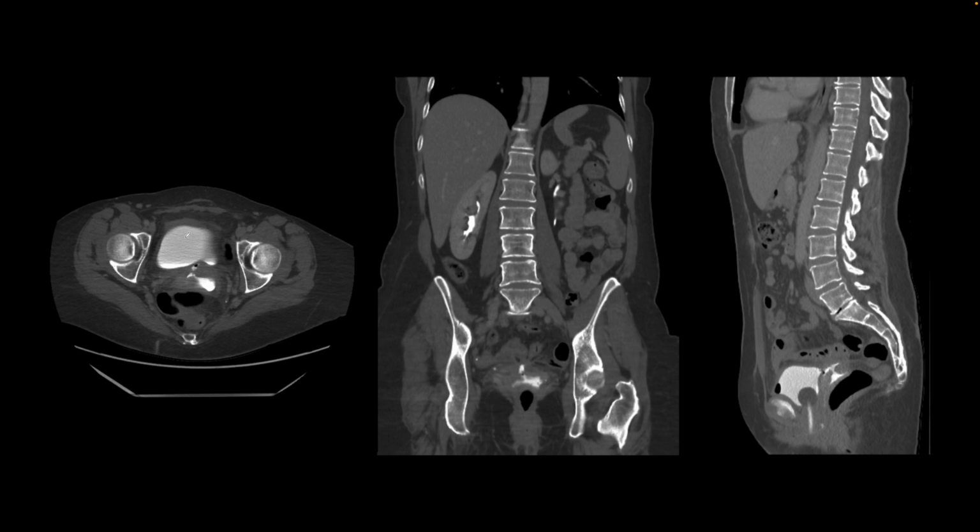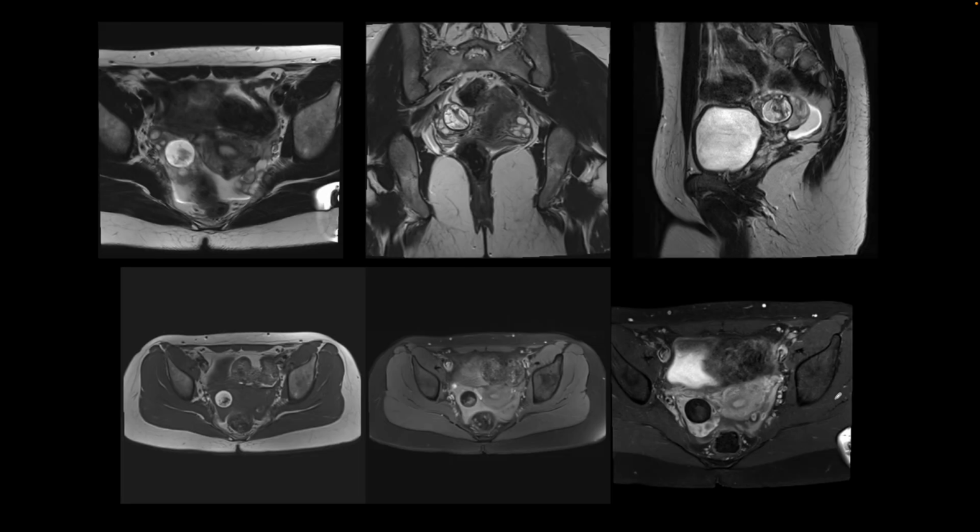The delayed images showed distension of the urinary bladder and contrast transitioning or moving from the posterior aspect of the bladder into the vagina. Patient also has a Foley catheter that was placed and clamped so that the urinary bladder gets distended to make this contrast movement and the diagnosis easier. So a vesicovaginal fistula as seen on a CT urogram.